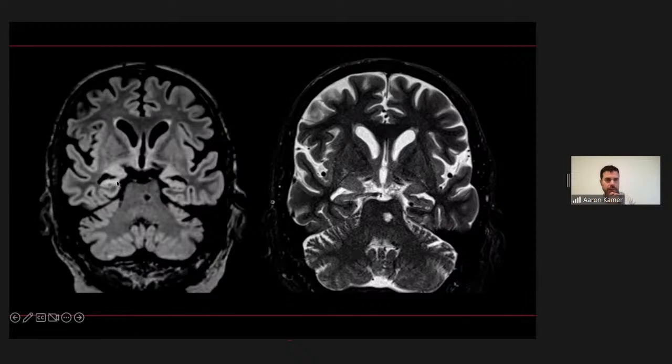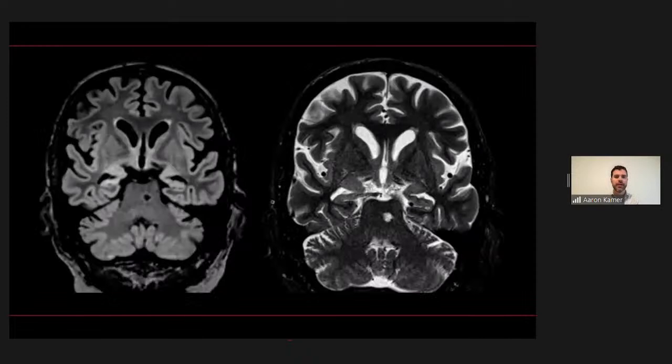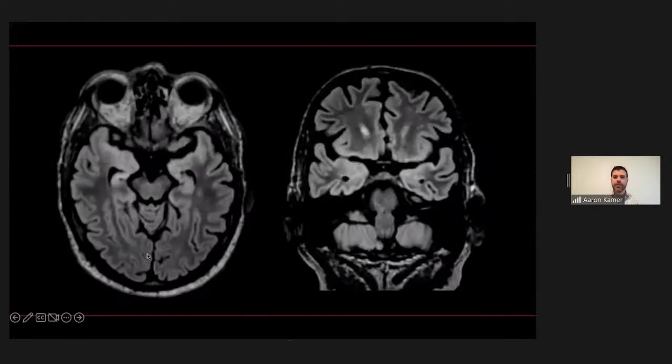And I love that you noticed that, the atrophy is pretty significant. We don't see any real good internal architecture, although maybe that's just a function of the quality of the imaging, because I feel like we can't see that very well on the left either. Totally agree. And then when we look at the axial images, again, we're trying to pay attention to the hippocampus on the right. And it's interesting to me, you were pointing out that amygdala on the right. And I said, maybe that's just cut, but do you feel like that finding that you noticed pans out at all on these images?